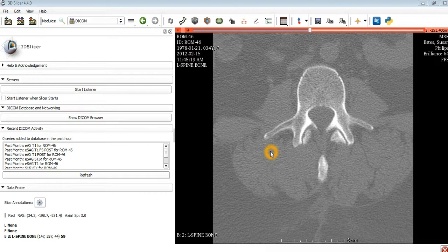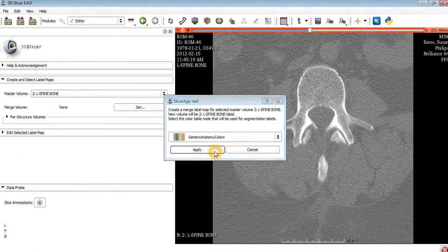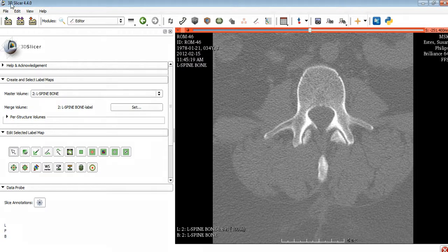So for this particular demo, I'm going to extract two surfaces, the inferior facet and the superior facet on, this is a patient's, I believe, the L4 on their left side here. So I'm going to extract again two separate surfaces, the one on the outside here and the one on the inside. So it's straightforward. This is unique to Slicer.